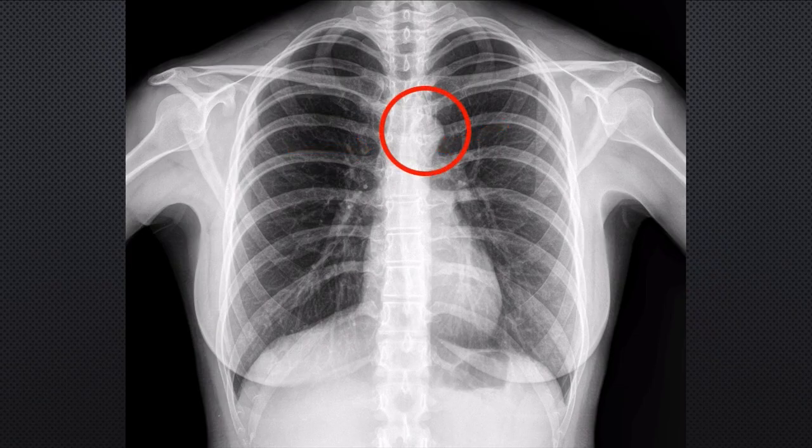You'll notice to the left of the trachea is a rounded structure representing the aortic arch. As we proceed down the midline of the chest, we see the right and left heart borders. On this normal chest X-ray, you might make a note of the size of the heart shadow in relation to the rest of the chest. There are certain pathologic entities that will enlarge the size of the heart shadow.